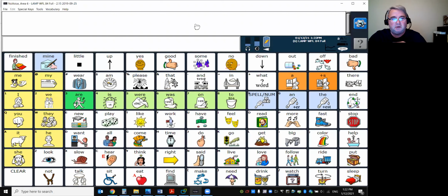Hi, I'm John Haller, and if you're using the NuVoice software on your Accent device with LAMP Words for Life or Unity, this is how you change a word's pronunciation.